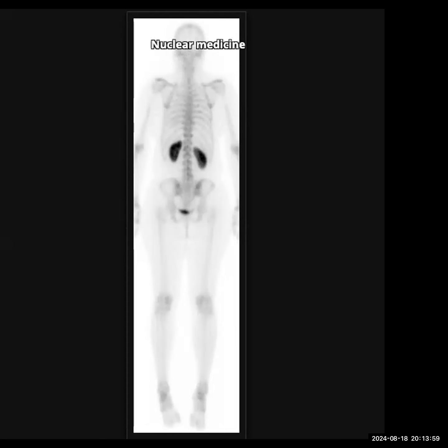So you did say that there is uptake predominantly in the kidneys, right? Yes, bilaterally. Okay, so what do you think? What are the possible causes for this appearance? So free technetium can cause, if there's free technetium within the body, I think it can cause an uptake within the kidneys bilaterally. If there's an increased dose of technetium, or it could.